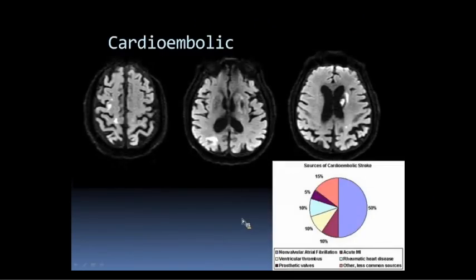And I didn't actually have a good CT example on hand, but this is a diffusion MRI, when you have varied territories, so on both sides, anterior and posterior circulation. So this is MCA territory, this is right PCA, right? This is right MCA, this is left MCA. Where is the source then?